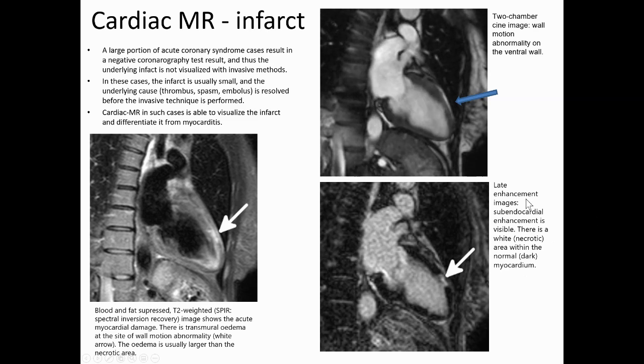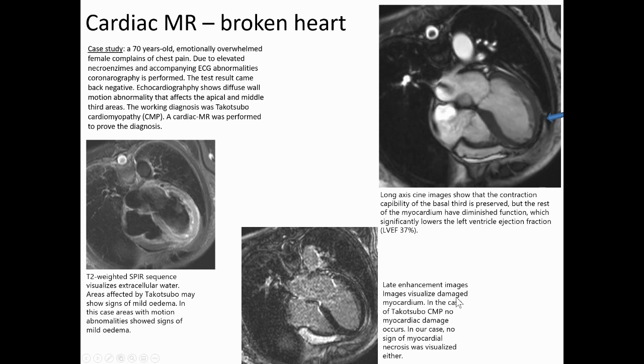So that's what we call late enhancement, because from administering the contrast material, we wait 15 minutes, and any area that remains white is dead. It's that simple. And the normal myocardium will remain black on these late enhancement images.